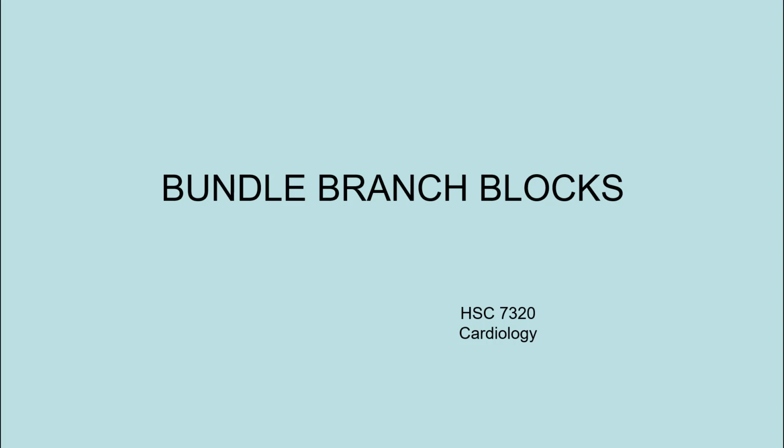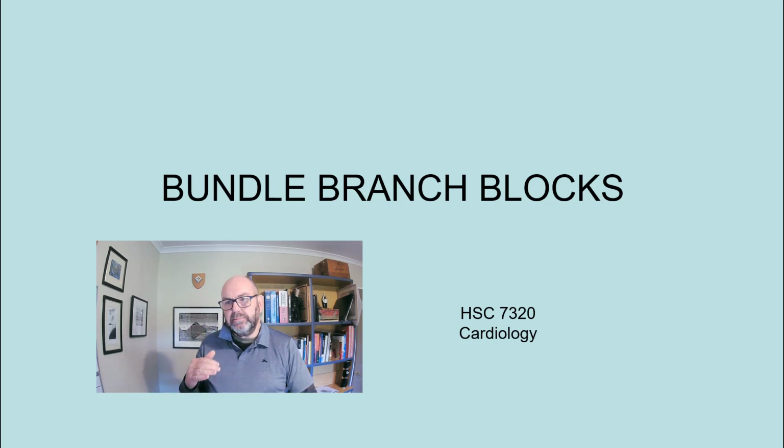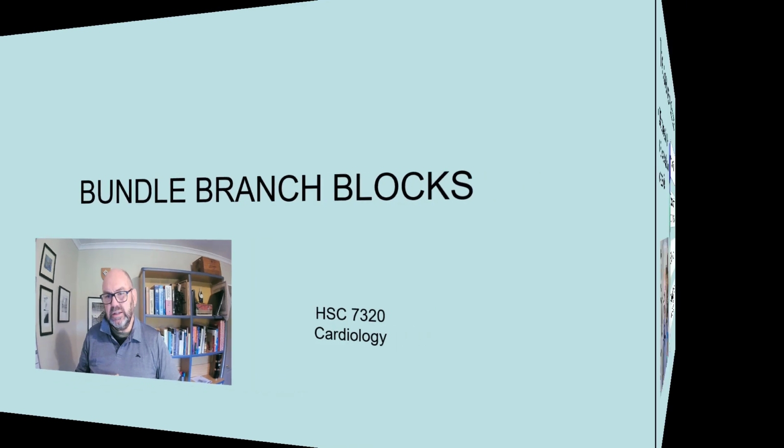This session reviews the ECG characteristics of a bundle branch block. They can interfere with aspects of ECG interpretation, specifically that of ST segment elevation. They're likely to produce a STEMI mimic, and recognising the block may prevent undue concern for all involved and unnecessary treatment or cath lab activation.